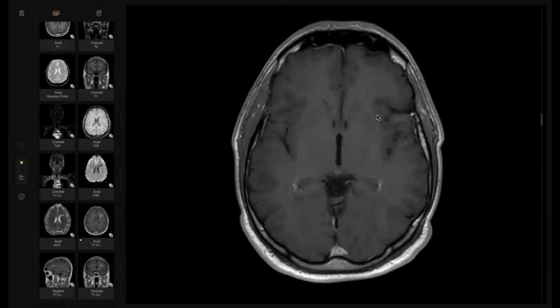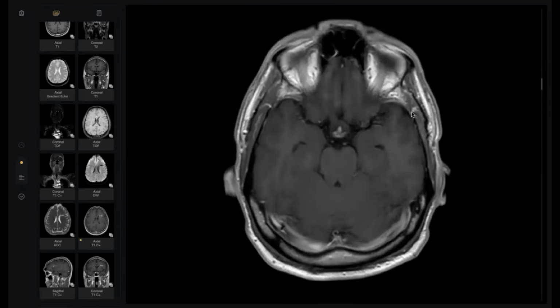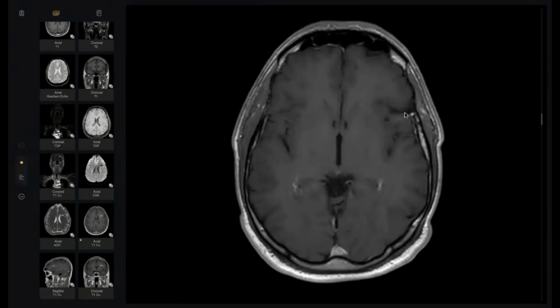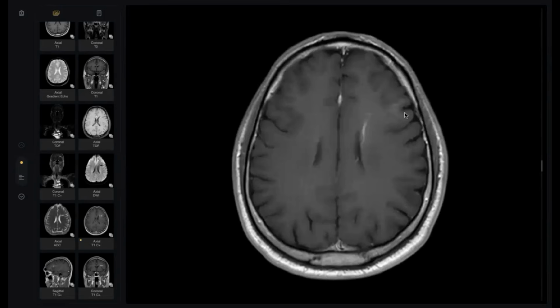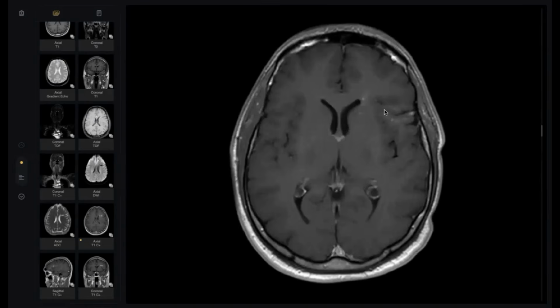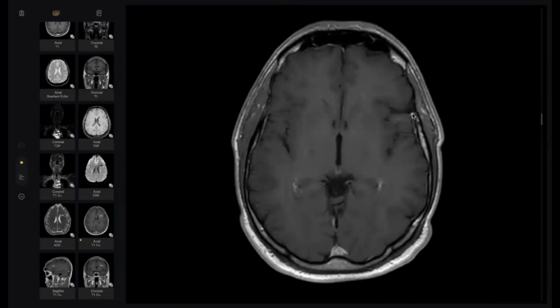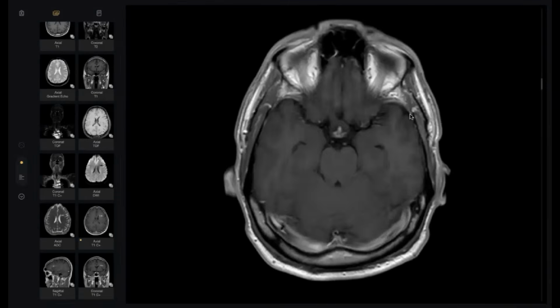And it is better also to tell the examiner, doctor, it looks like this drained to this one vein here and it drained here. Actually, this DVA starts here from the subependymal region and is collected here. Finally, this is the draining one. You should go up, not going to the cortical vein, but it looks like it goes down.